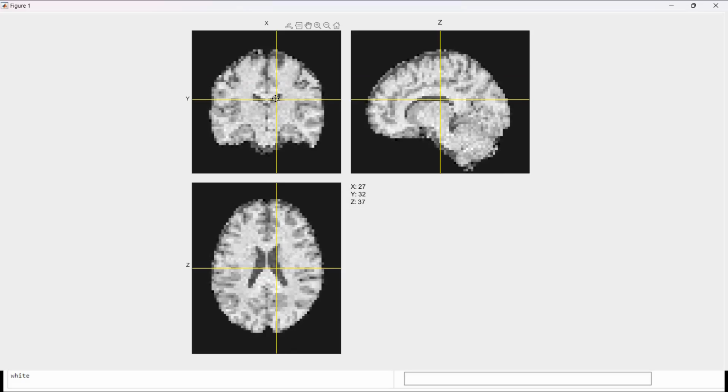The bigger brains are squished a little bit, the smaller brains are stretched a little bit, and then you map them to a template called the MNI template. MNI comes from the Montreal Neurological Institute. They created this standard space. Just for demonstration purposes, I had all the images in MNI space, and that's the reason why you get a clear image like that.